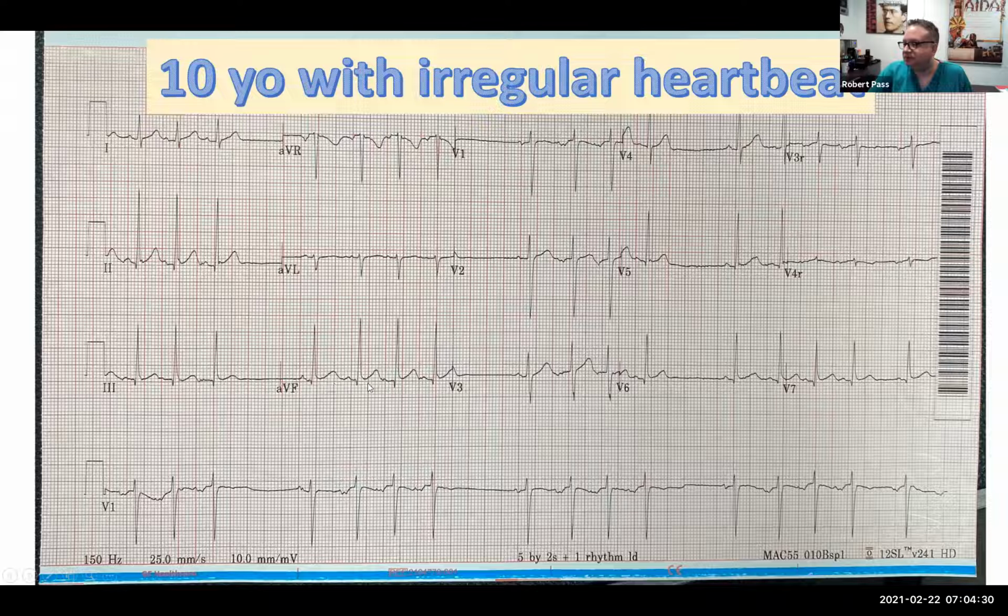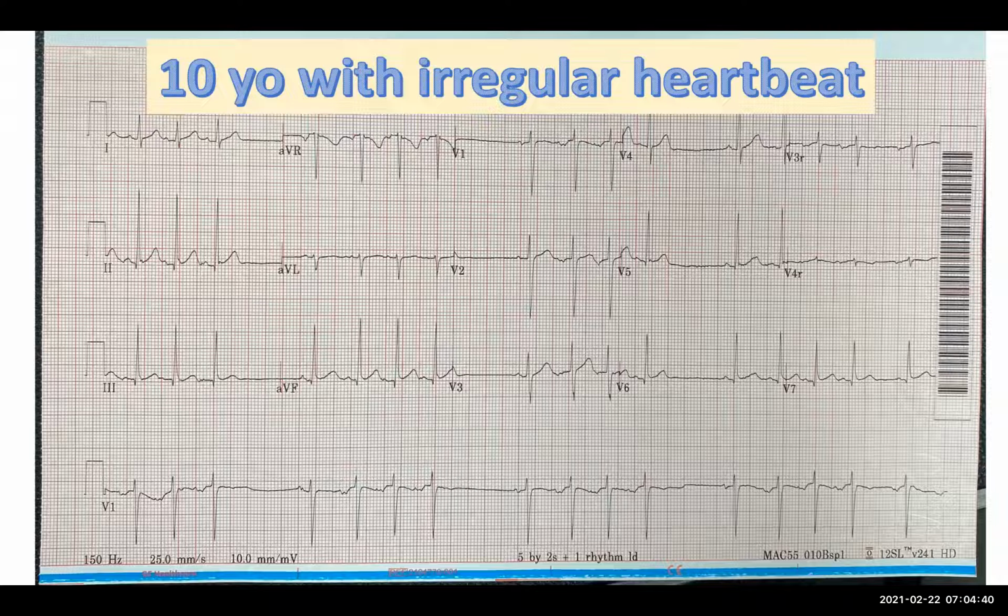It's a subtle difference, but right, there's a little bit of a double hump here. Right. So is it like an ectopic atrial focus beats, and then that P wave, which is dropped, maybe like a blocked PAC?